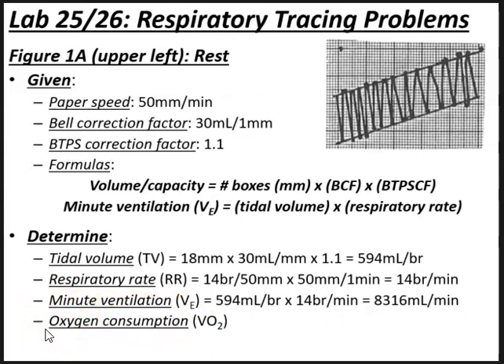So our last variable that we are going to get is oxygen consumption. And we can, again, use this tracing to help us determine what oxygen consumption was for a person at rest.